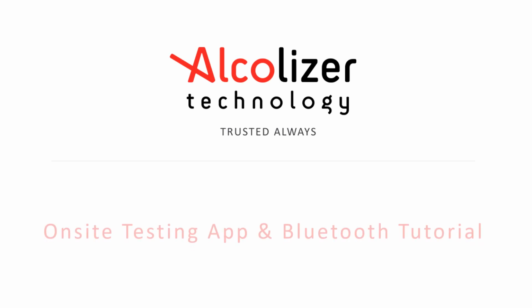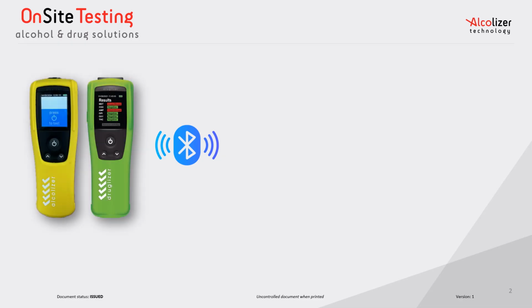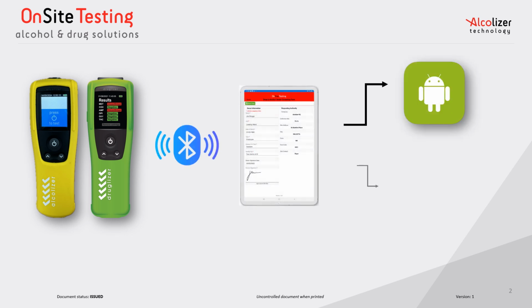Welcome to Alcolizer's on-site testing app and Bluetooth tutorial. Alcolizer LE5 and Druglizer support Bluetooth communication between both Android and iOS platforms.